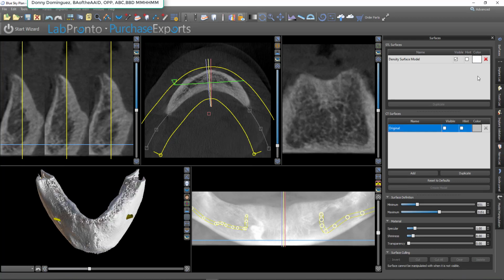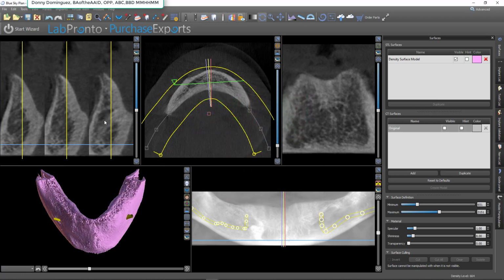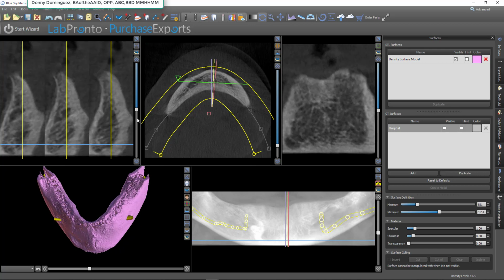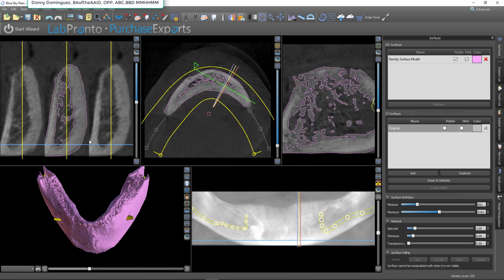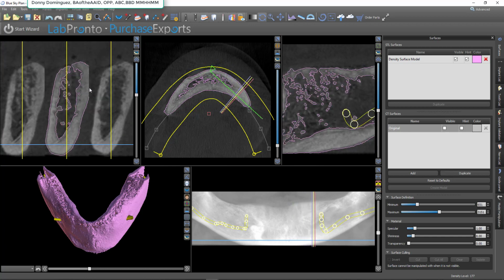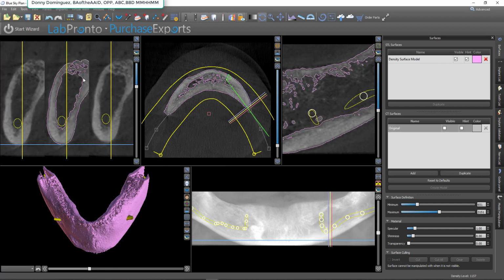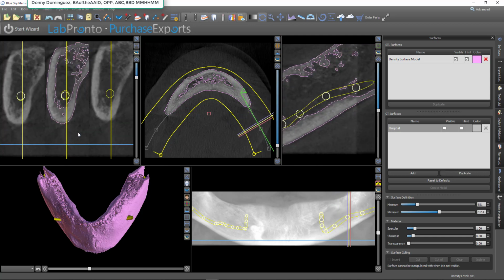Okay, so now that it's done that, we have our segmented jaw. This is the one we expect to have some porosity. It's not going to be adequate just as is, but I do want to take a look at the hint and just see how severe all that porosity is. And what I'm seeing is a really well defined cortical bone on the lingual and on the buccal, and I'm really only seeing those issues of porosity right up top on the crest.